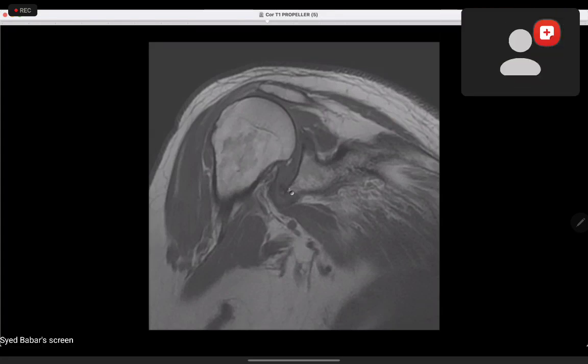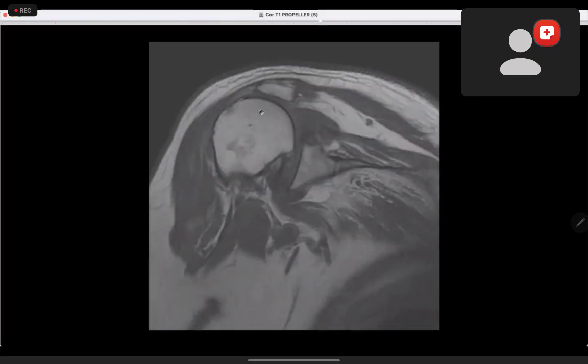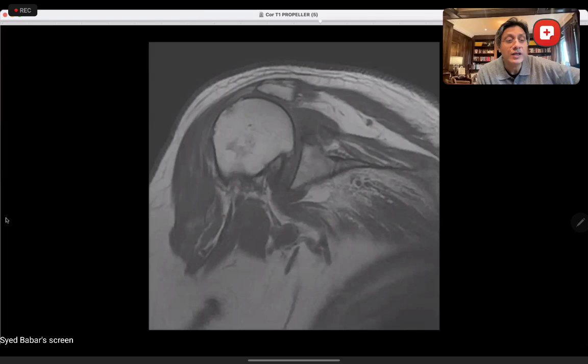So I have a question regarding this study. As we saw in this case, the supraspinatus is completely torn, and you said that this acromion is type 1 or probably type 2. I'm a bit confused because the supraspinatus is torn, so the space between the humerus and acromion would automatically be reduced. As the space is reduced, how can we identify the type easily? Because to me, it seems type 1.